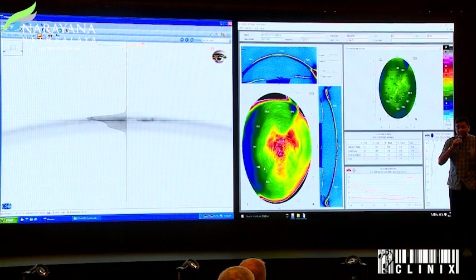Any other questions? Yes, ma'am. I'm using the ABCD. As I mentioned before, it's a multi-dimensional diagnosis. And if I'm looking at that chart, I see what has changed, and then go into detail and see whether the information on the back surface is really reliable, and look at the Scheimpflug images. Like in this case, you can see that the edge detection might not be exactly what we want. And then we do the same thing with a high resolution OCT and find out that ABCD was totally correct, the posterior surface has changed significantly, and then we trust the ABCD in this case.